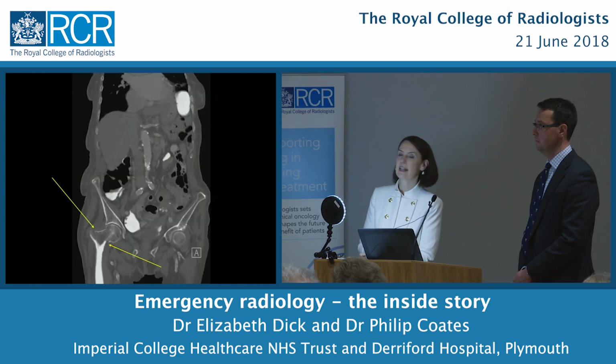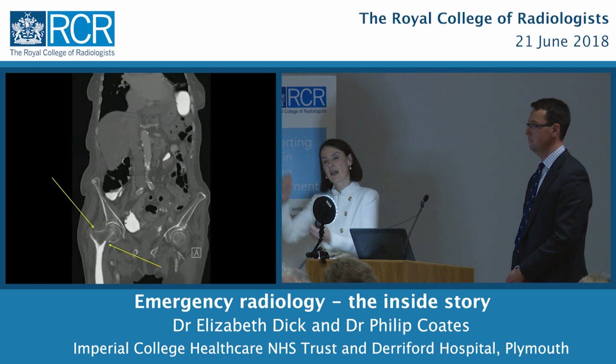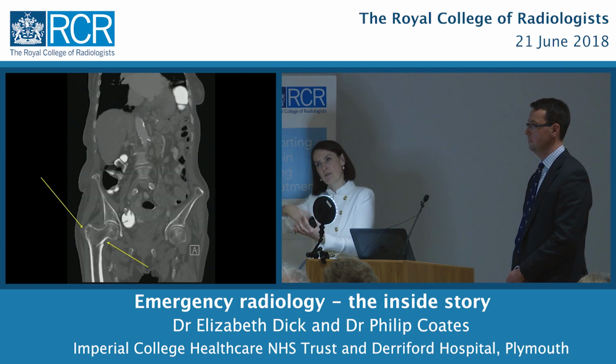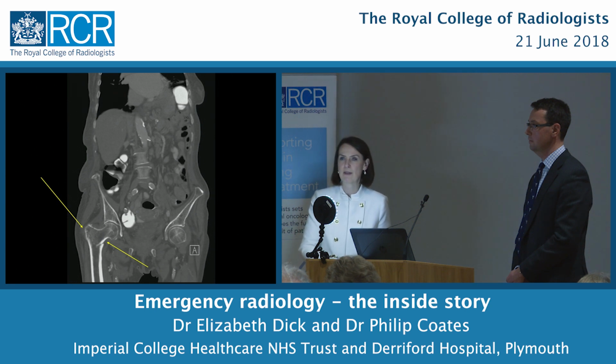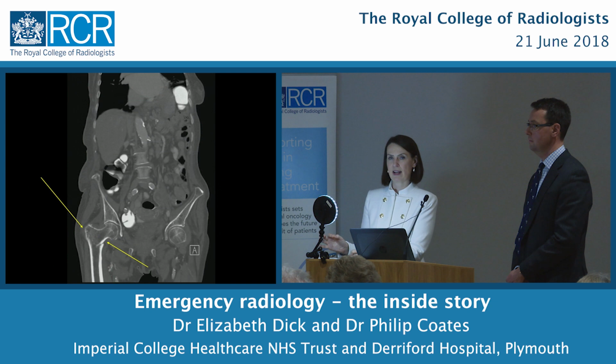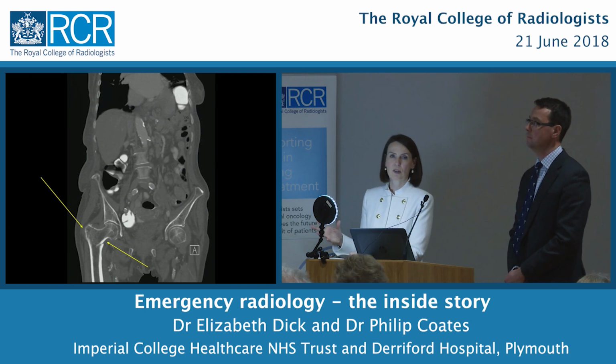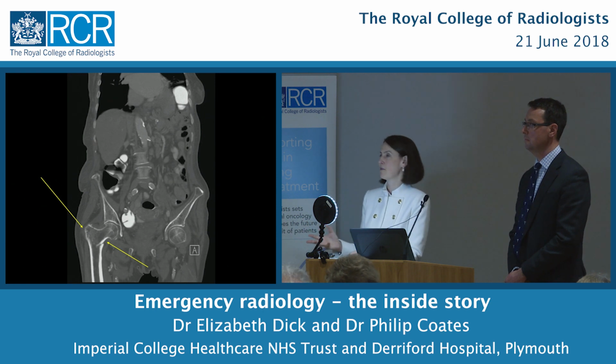And here's the CT, and on the CT we can see not only does she have a fracture, but the bone has actually impacted, because poor thing, she was trying to walk around on it, so she's kind of crushed the bone down. So she no doubt had a fracture at the time that we did the original plain film. We just couldn't see it, and that is a hazard of plain films.